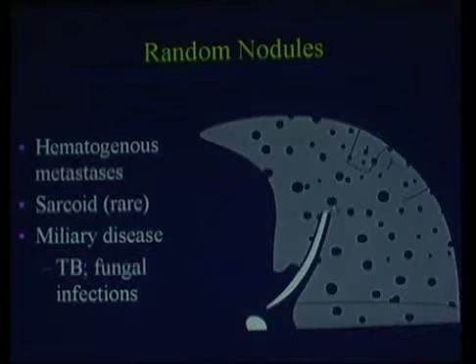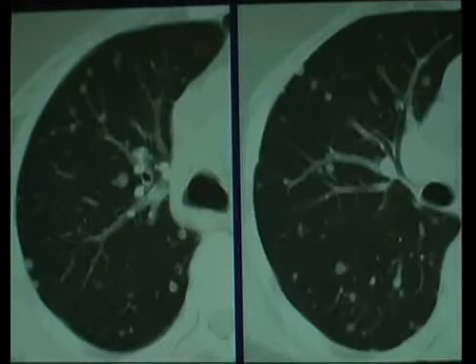And the nodules for both hematogenous disease and miliary disease, for the most part, aren't those kind of little fine, little gravelly things that you see in sarcoid. They're much better defined. So that's hematogenous disease. Doesn't look anything like sarcoid, obviously. And sure, some of them are going to be subpleural, and occasionally they're going to be along the axial interstitium, but they're clearly random in the sense that they're pretty much everywhere.